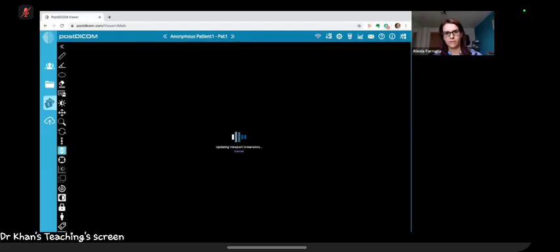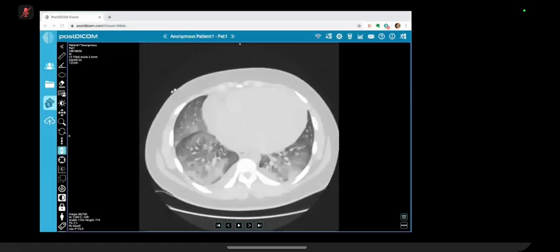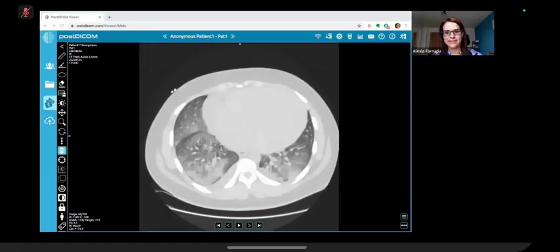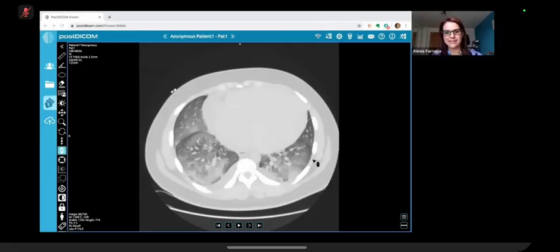Again, going by the same theme as you initially suggested, with ground glass opacification bilaterally in both bases in a young chap, I would be worried if there's some sort of pulmonary hemorrhage causing it. Pulmonary edema would be in my differential because of the large heart as well. And there is also some effusion on the right side, so it could all be related to a cardiogenic cause with pulmonary edema and effusion. Can't really think of anything else in my differentials.